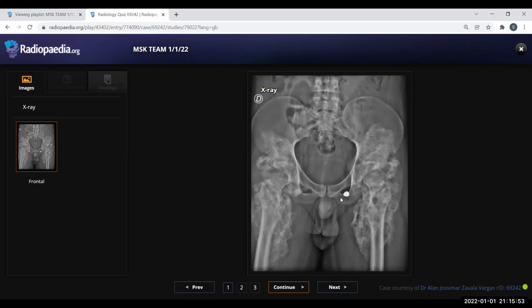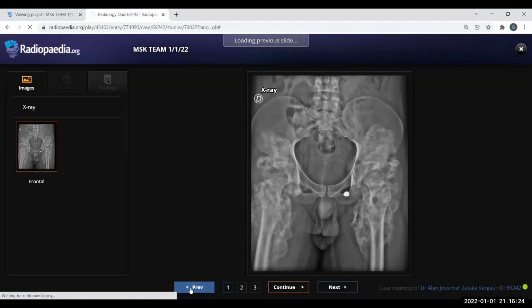Okay, that is congenital. But this one, you can say in the exam that because I see a radiopaque foreign density, which is rounded, most likely a bullet, this patient must have gone through some traumatic injury, most likely to some sort of paralysis, which has led to bilateral myositis ossificans in this case. Okay, well done. So this was well done.